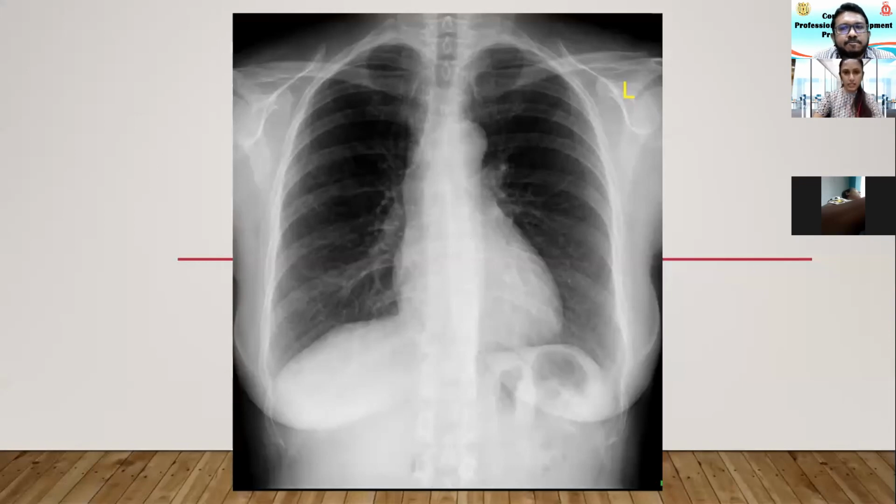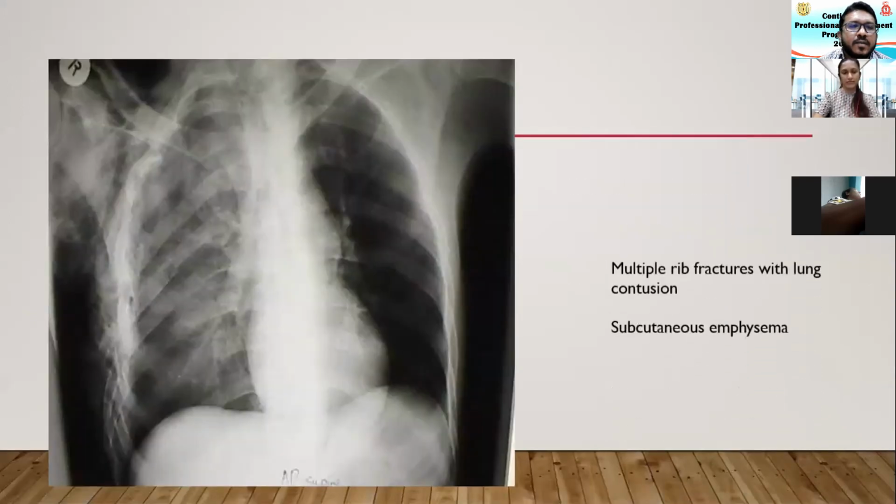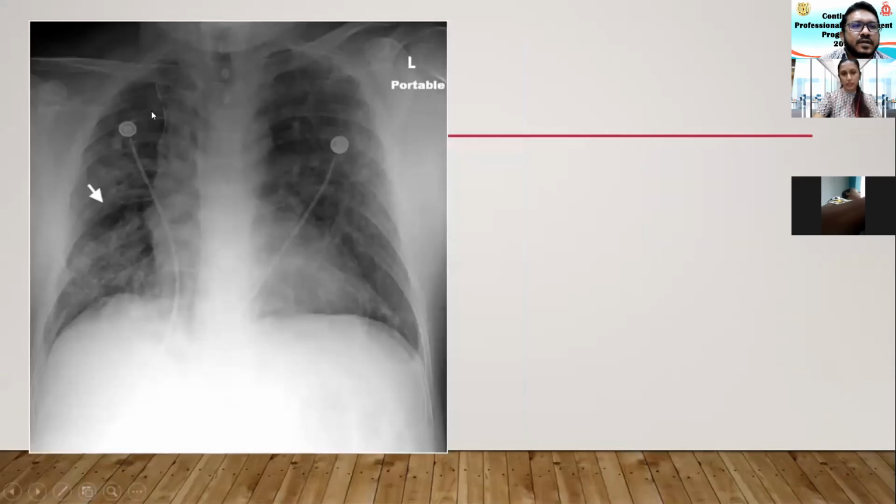Can you please explain again how to identify pneumothorax? Pneumothorax is very easy. There are two things to identify pneumothorax. One thing is to identify the lung marking. So if you see here, there's an edge here, and the other thing is you have to trace the lung marking up to the lateral chest wall.